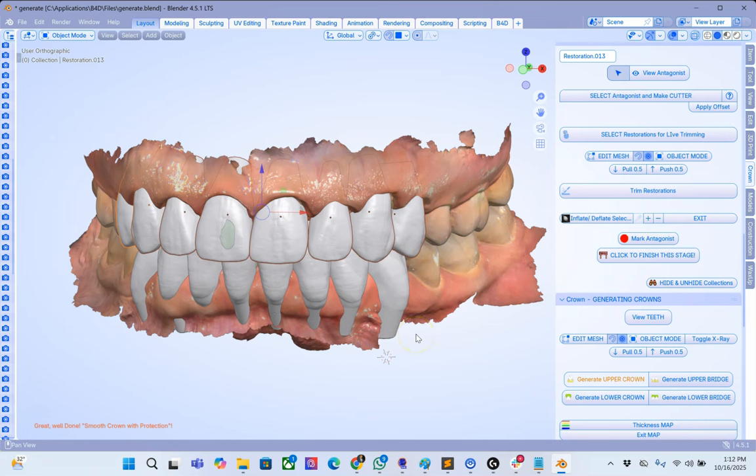This is going to take a while. Usually it could be between 20 seconds and a little bit longer depending on your computer speed per tooth. So here already we're looking at 8 times 20 or 30 seconds. So a couple of minutes. So please be patient and let the computer do its work. Rather that than our hands do the work.